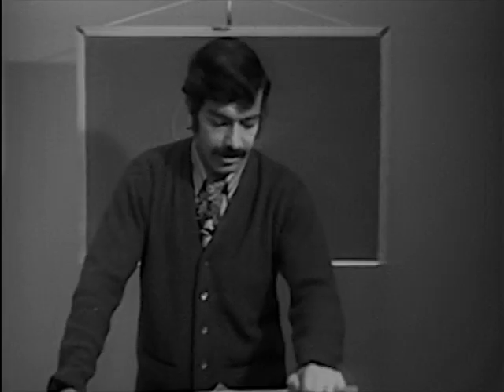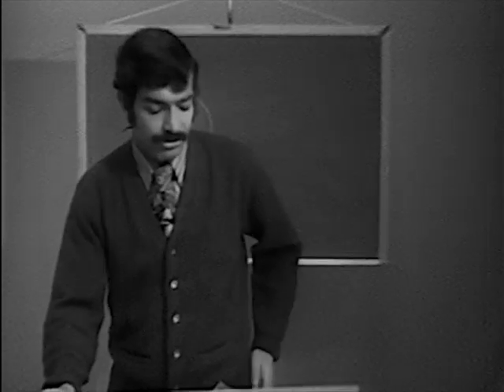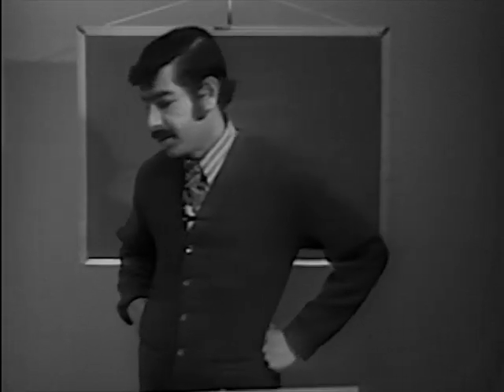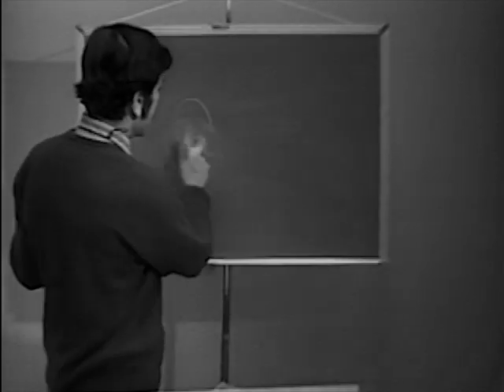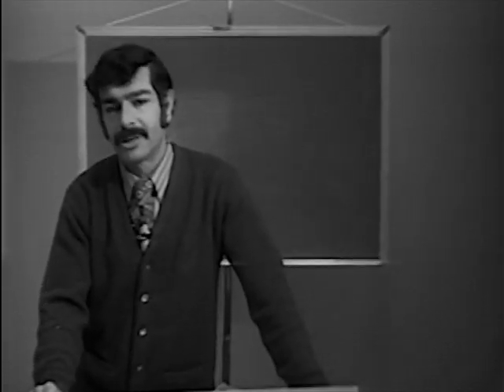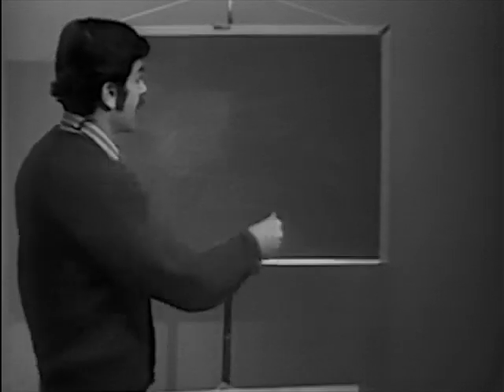In starting this basic course in electrocardiography, the first thing we want to do is to review some fundamentals. These are some of the things that you just have to know in order to be able to assess an electrocardiogram. Okay, the first thing I'm going to talk about is heart rate. There are several different ways of determining heart rate, but what we want is a simple and practical method for doing this.